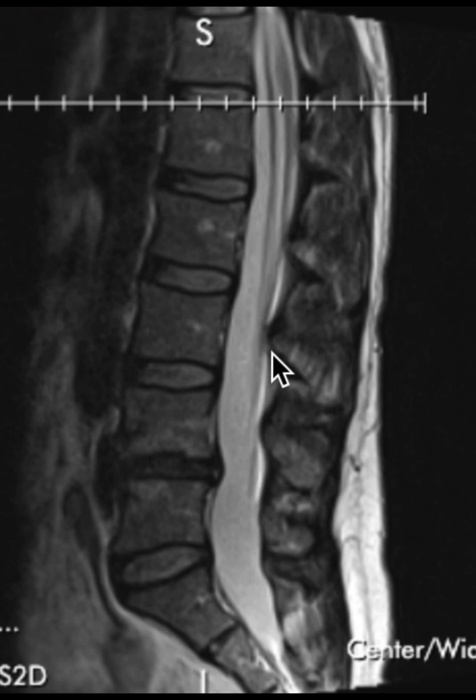So remember, the spinal canal is where the nerve roots live, and when they get pinched, they can cause symptoms into the legs. The other thing to note here is there's some whitishness right here, which might represent some increased pressure or edema of the vertebral bodies also within that same region. Now, whether or not this is a sign of pathology is really dependent on if the patient is experiencing symptoms.